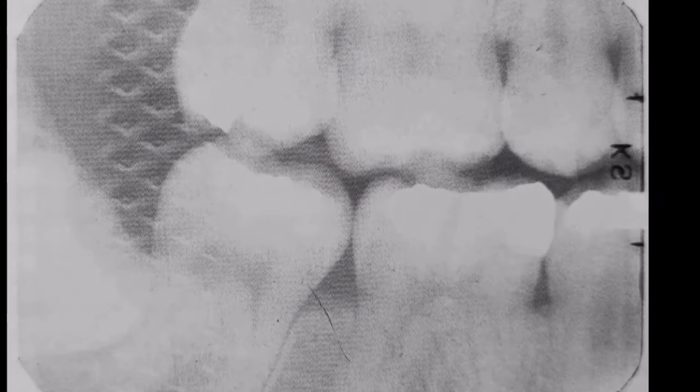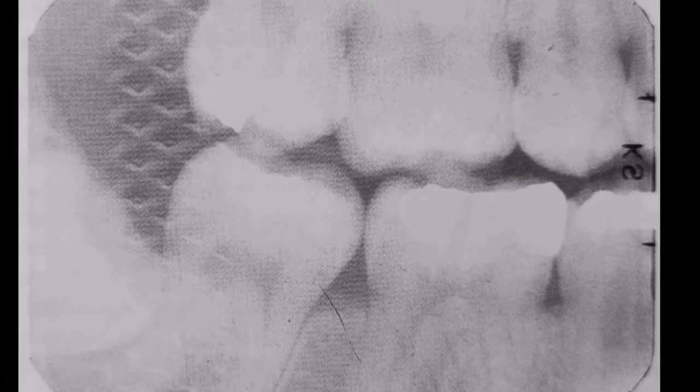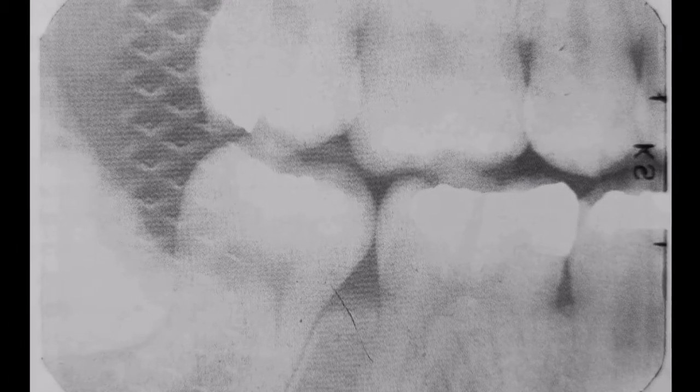So when the film is placed wrongly, like tube side towards the patient and label side towards the X-ray tube, it produces a characteristic light radiograph and also shows the embossing pattern of the lead foil.